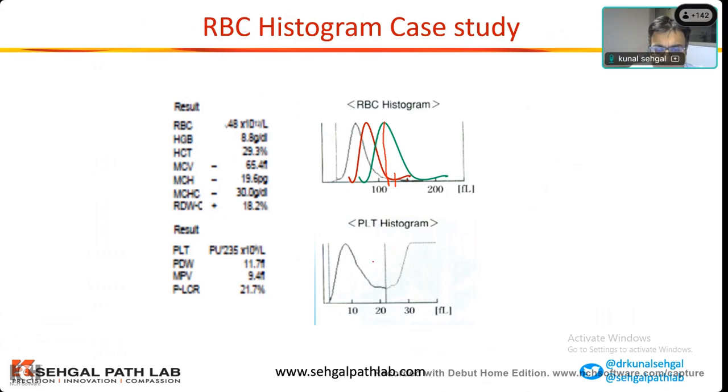Now, Dr. Sudeshna, we come back to you. We go to the platelet histogram. Can you tell me, is it starting from the baseline here on the left hand side? Yes, sir. On the right hand side, is it reaching the baseline? No, sir. It is not. Is the RBC curve reaching the baseline over here? It is not touching the baseline, the RBC curve. Correct?